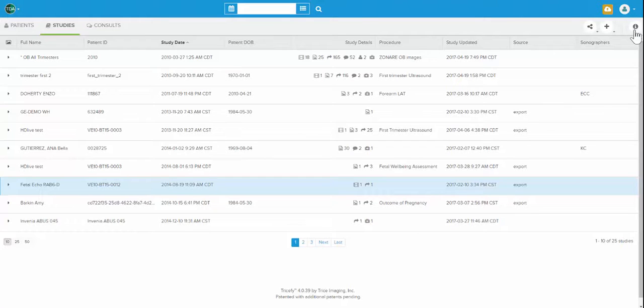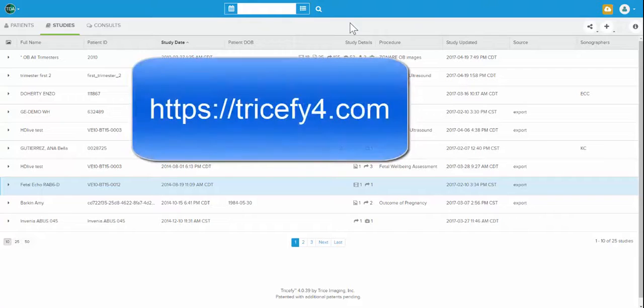Okay, as I mentioned, this was a quick introduction and overview of the new Tricefy 4.0 features and website. Don't forget, you're now heading to Tricefy4.com. An advanced video will be available shortly.